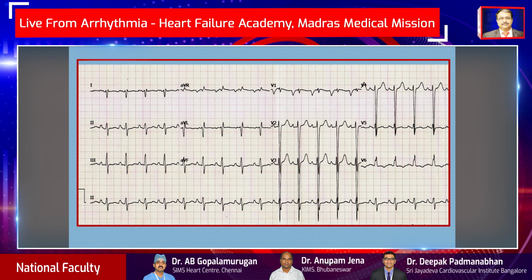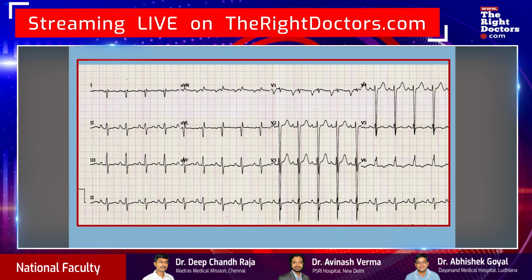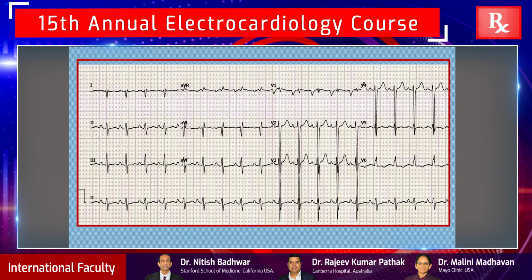So this I put up because there are a lot of things in this ECG. When I did my general medicine, my friend always used to get this diagnosis of dilated cardiomyopathy right on the ECG. I used to ask him, how do you get this DCMP correct on the ECG? And his answer was simple. He says, when there are so many changes in the ECG and the patient is sick, then that is dilated cardiomyopathy.